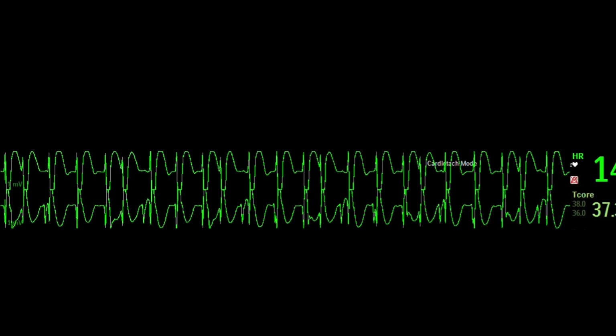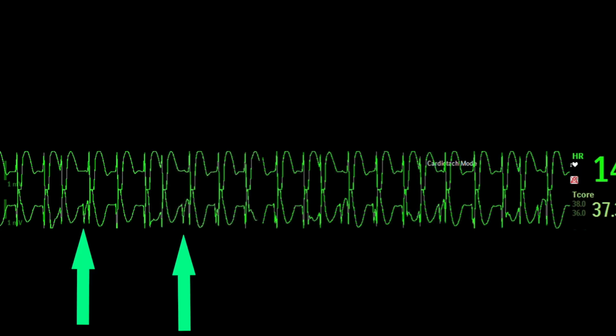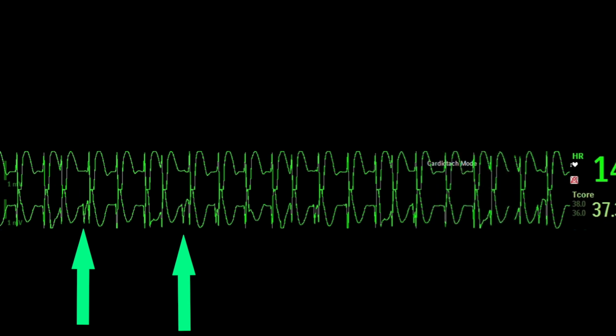There is also a device on the market that provides a continuous atrial tracing on the monitor so changes in rhythm can be seen in real time. But to keep this channel free of commercial interest, I'm not going to tell you what it is.